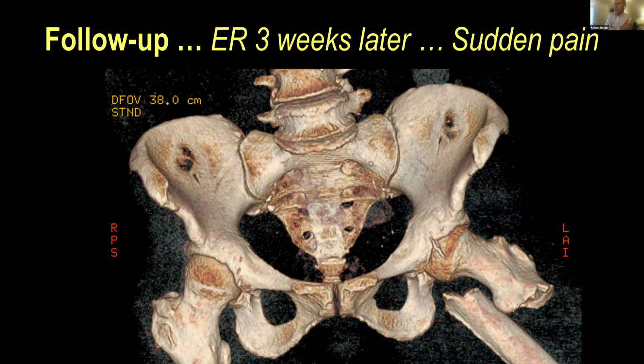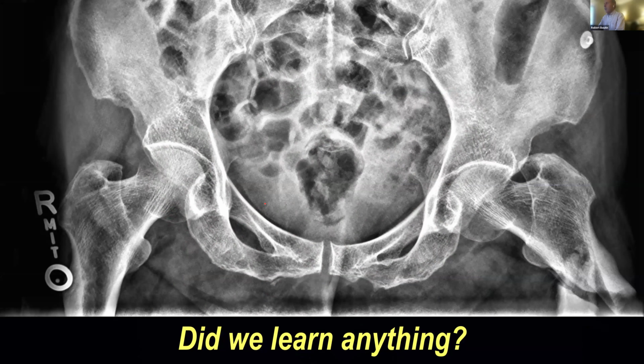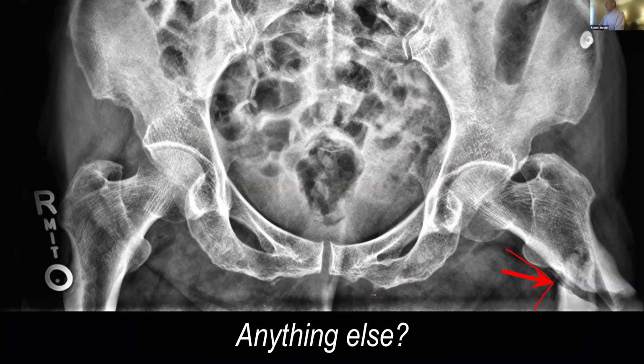Well, in this particular case, the patient came into the ED 3 weeks later, sudden onset pain. Here was their CT and their radiograph, and you can see they now have completed their fracture. It's displaced, they're angulated, and this is much harder technically for the surgeon to address. And so we need to keep our eyes peeled for those before they complete and displace.